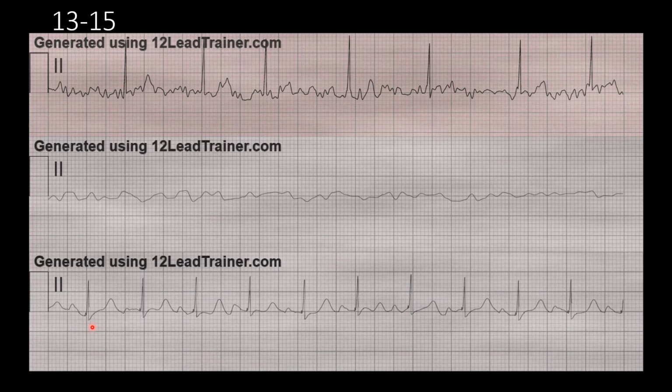So it's kind of tricky to say. The thing that would be hard with this to determine is the fact that they appear to all be positive and upright facing, so it doesn't appear to be an atrial thing so much, but at the same time with the different appearances like that it still can be. So what's important to remember is that atrial P waves don't have to be inverted.